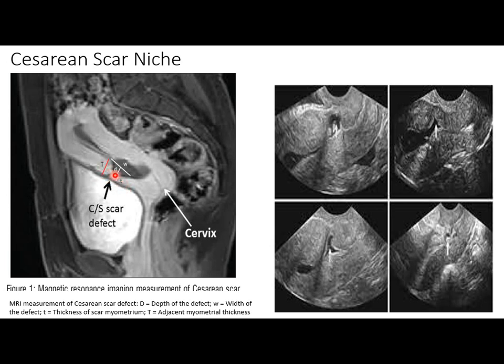This is atrophy. And I have seen cases where this is a cause of secondary infertility. The patient presents sometimes with secondary infertility due to the lesion. In the dehiscence, the myometrium is not remaining, just serosa remains, while in scar niche, myometrium remains, but thinner than the other area because of the site of the scar.